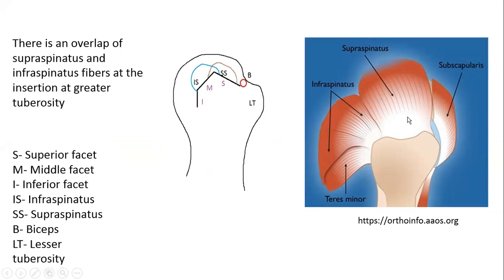Now 4 to 6 fascicles are completely torn, so they are retracted medially. But 1 to 3 and 7 to 10 are still intact. So if you divide the tendon like that, in this area, between 4 to 6, those tendon fascicles or tendon attachment at the footprint is completely retracted medially. That would be a focal incomplete full thickness tear. It is full thickness, but it's focal full thickness. Make sense?